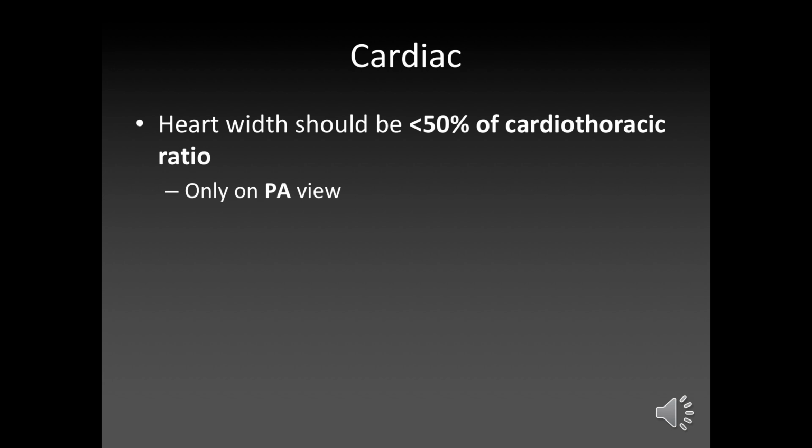And often radiologists and consultant doctors will make that assessment on an AP because they've seen so many of them, but you can't, as a junior doctor or a med student, reliably say that. And you should always add that disclaimer on.